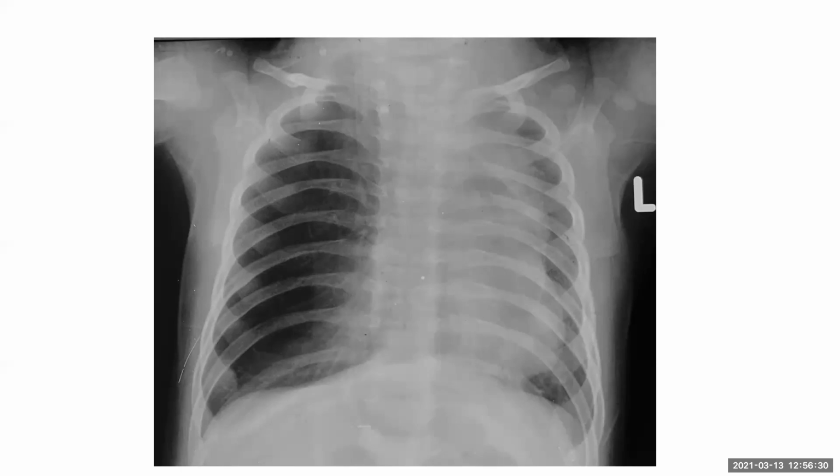I can appreciate that I have been provided with a frontal projection chest radiograph of a child who presented with repeated chest infections. The striking abnormality in this radiograph is an opacification which is overlying the mediastinal region. Now I'm closely looking at this abnormality. As this is a 4-month-old child, I'm also thinking about the thymic shadow. I'm looking for any other abnormality as well.